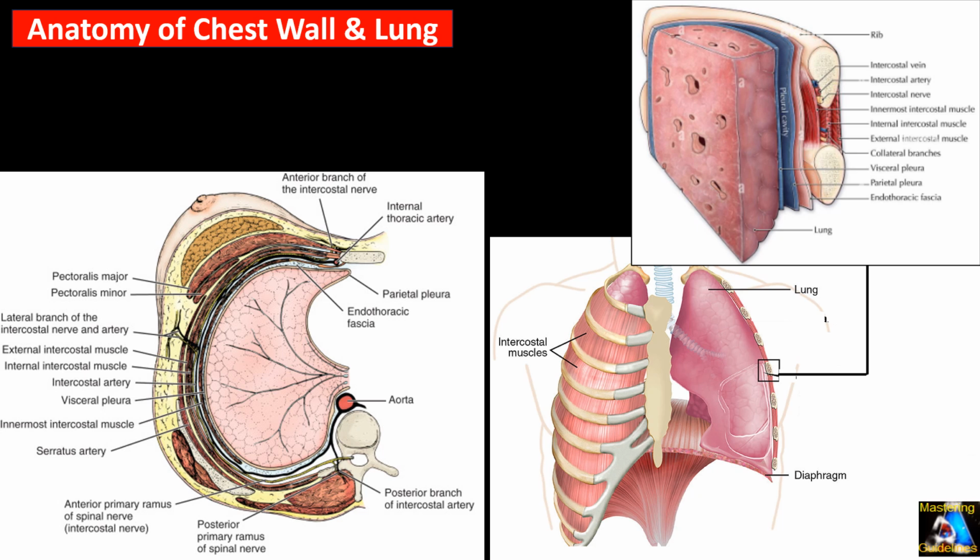We have to remember that the ultrasound has two enemies, air and bone, or calcification. In those situations, sound cannot propagate. So the ultrasound of the lung can scan and check any structure from the skin up to the pleura.